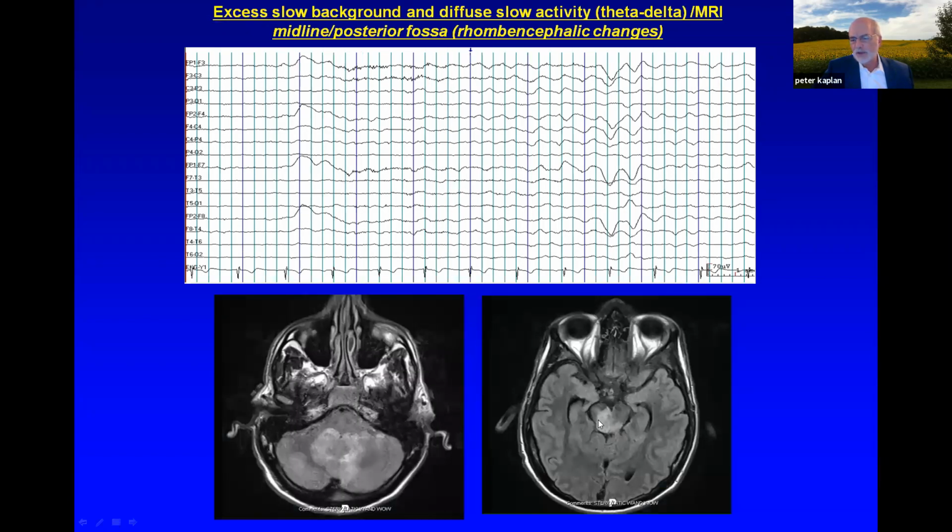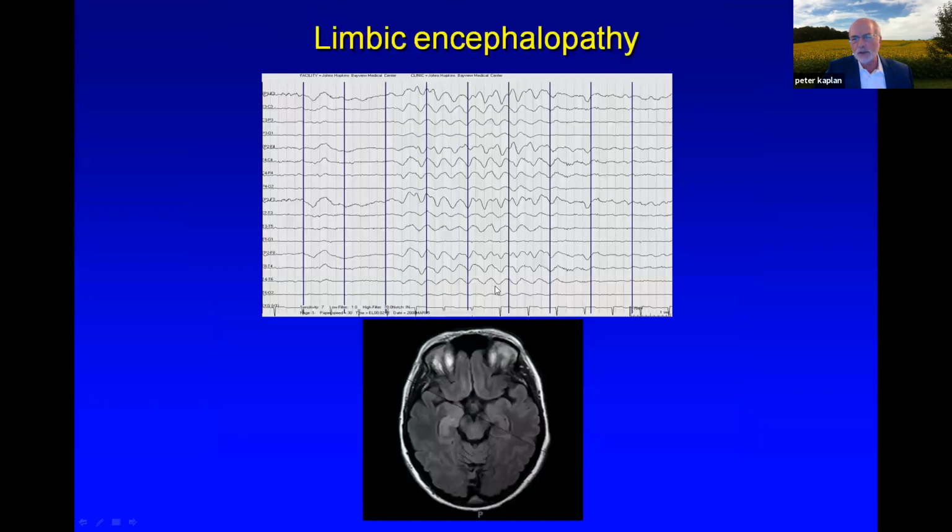Here, for example, you see a patient with deep midline rhombencephalic involvement, and there's swelling, and therefore there's interruption of the ascending pathways of arousal. And what you indeed see is after the eye blink, the patient is more awake, but as you stop stimulating, they slow down. So this shows again, and this is how EEG can be helpful, the reactivity of the EEG to stimuli reflecting interruptions in arousal mechanisms. Because the cortex is relatively preserved, the patient's cortex is producing relatively normal EEG.